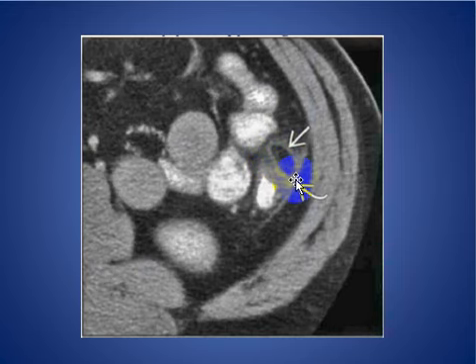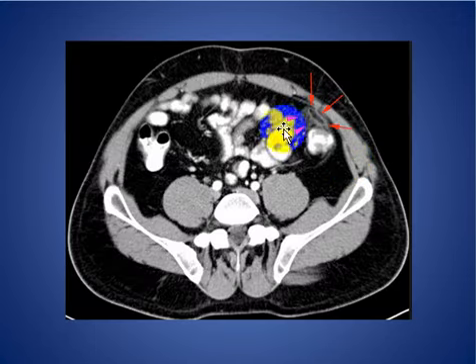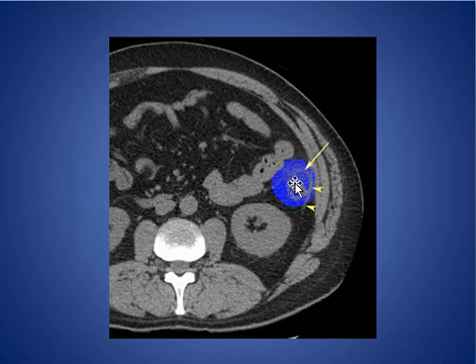an oval-shaped fatty mass lesion with a hyperdense sclerotic rim and surrounding inflammatory stranding changes associated with thickening of the overlying peritoneum. No surgery needed for this mass lesion. Another example of epiploic appendagitis in another patient. Another patient with epiploic appendagitis.